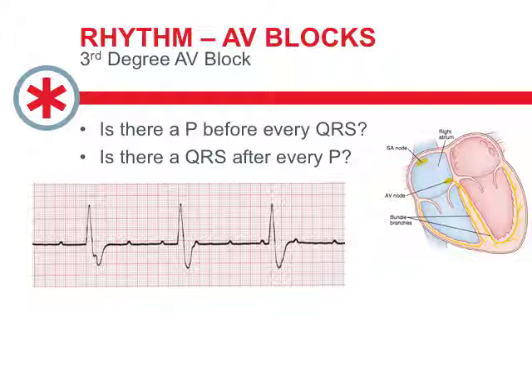The ventricle is beating at its own time, and that's the wide QRS as you see, but they're not in sync. And the thing that often gives this away is that the PR interval is changing all over the place. If you see that, you should then map out your P waves, which should be basically walking in sync, map out your QRSs, and the ventricles are walking in sync, but the two aren't talking. So this is a third degree heart block, a bit of a big problem because people can become quite hemodynamically unstable with this and end up in trouble with asystole.